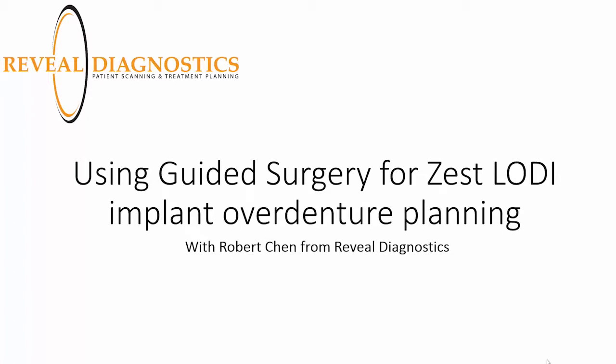Hello, this is Robert Chen with Learn LODI, a free resource for learning how to market, treatment plan, place, and maintain locator overdenture implants. The purpose of this video is learning how to utilize cone beam CT scans beyond just treatment planning and actually translating your treatment plan into a CAD/CAM implant surgical guide.